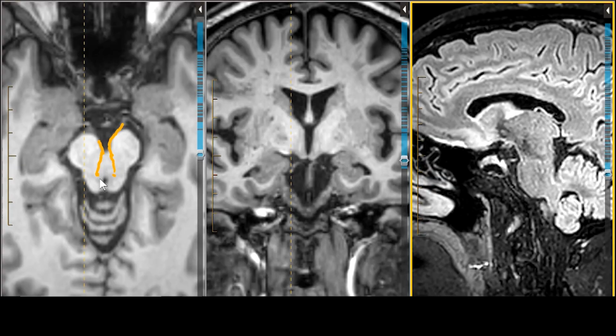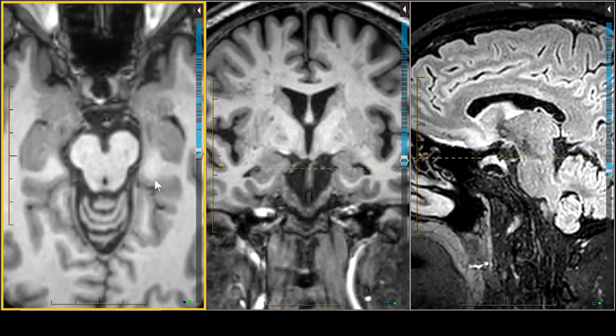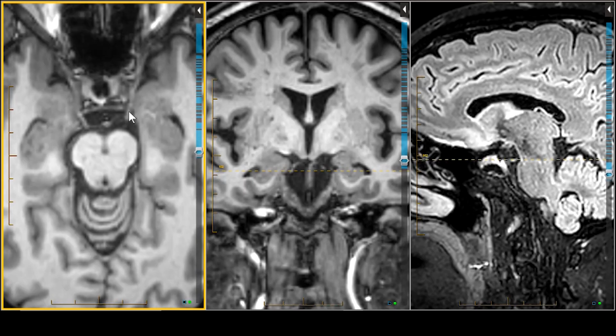You can see it right there. I'm drawing over it right now, and I'm drawing over it again on the right side. But look at the long intramedullary, intraaxial course in the brainstem of the third nerve. That is why the third nerve is so susceptible to compression in the midbrain, because it has a long longitudinal axis. Now I'm going to take my lines away, my orange lines away, and you can follow the third nerve as it continues onward.